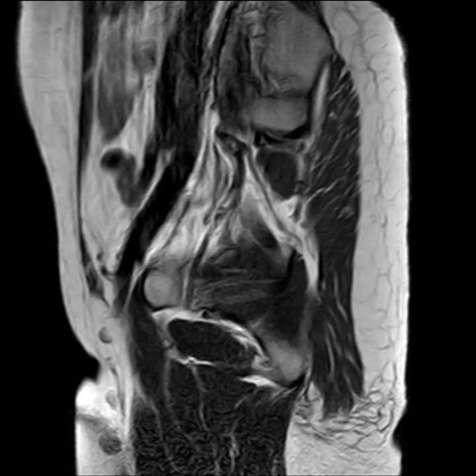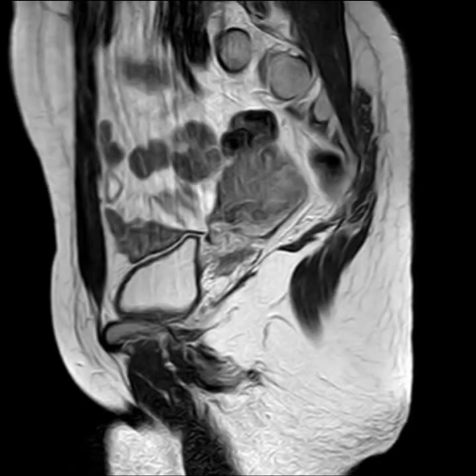So this is a case of a 29-year-old female patient presented with vaginal bleeding. Her ultrasound exam was abnormal, so pelvic MRI was recommended and done for further evaluation. Well, okay. First, let's start scrolling through these images. What do we have here?